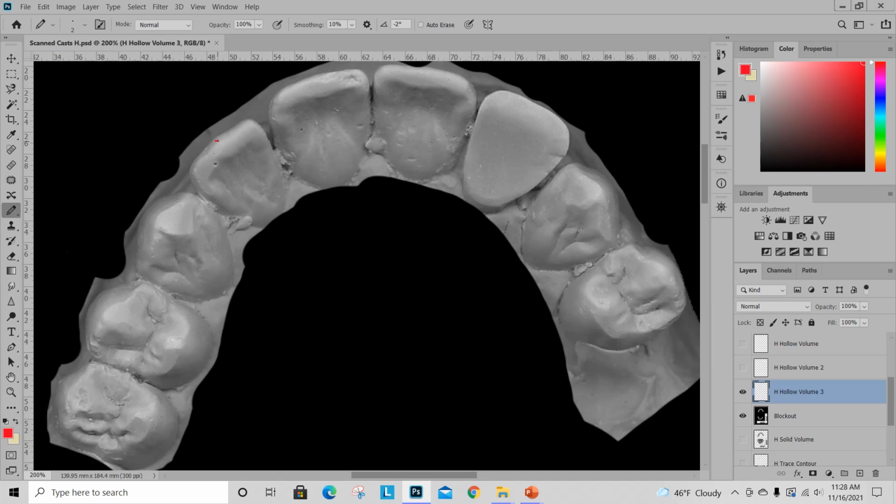And then we are simply going to freehand draw the outline that we think is the outline of our teeth. You're going to do this for every single tooth that you think you need to have in your overlay. So you can see where this is subjective, because I'm basically just determining where my mark is going by freehand drawing it.